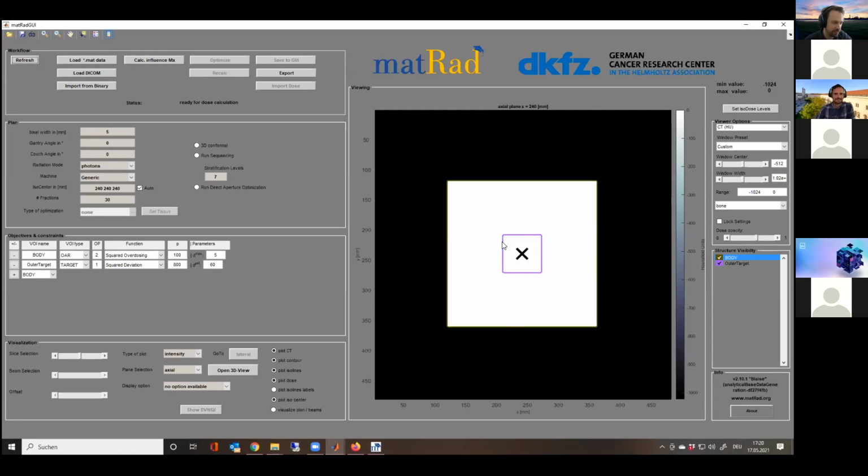And there's a structure delineated here which serves as target. So that's how you can interact. You can advance with scripting and calling commands, but then keep the user interface up to date.